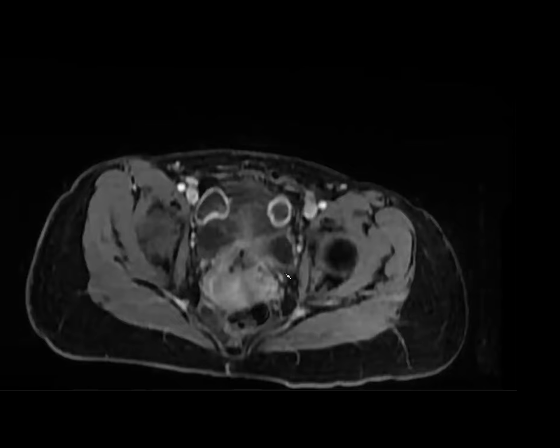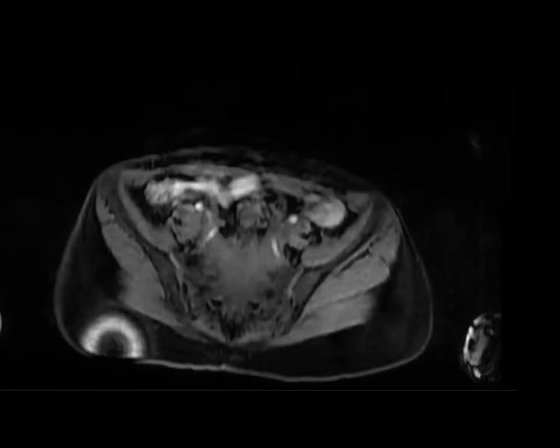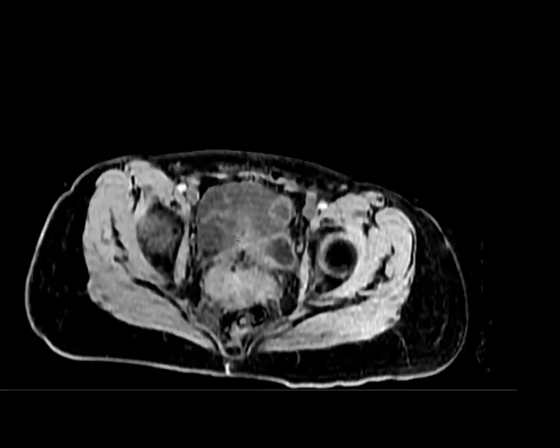I guess that's possible. No. Because both of these were enhancing. I mean, you should only have one follicle, but that looks like a follicle. It does look like a follicle, but it's enhancing and it's not T2 black. So I wouldn't have called that the perifollicular hemorrhage, to be honest.